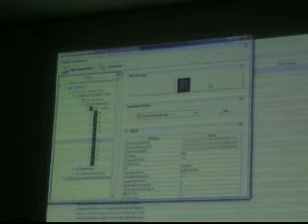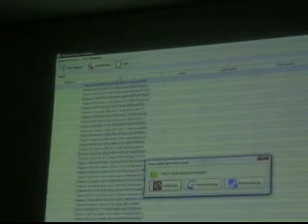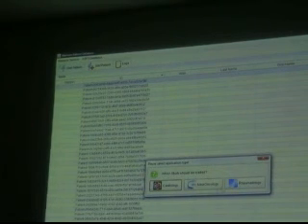So there you will find all the data you entered in the Remind data acquisition system. But then you can do more advanced things, as we saw with the CaseReasoner. So you can select a patient, and as you would have for data types in the patient folder, you can select an application to run. For instance, here you can run the CaseReasoner on that patient. There you have to select what study you want to access. So in our case, it's cardiology, for instance.